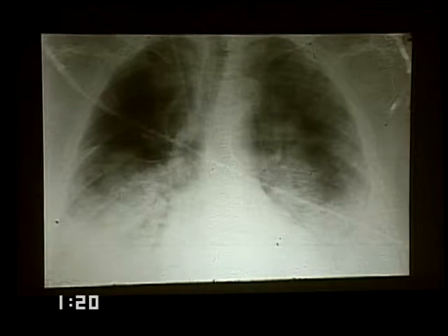This, now remember, is not just the fluid that is aspirated, it is the capillary leak that occurs as a result of the fluid. If the fluid that were aspirated were relatively neutral with a pH of about 5, this appearance would take quite a while to develop. If it was a young individual who aspirated a large amount of acid gastric juice, this would appear within a matter of hours, very quickly.